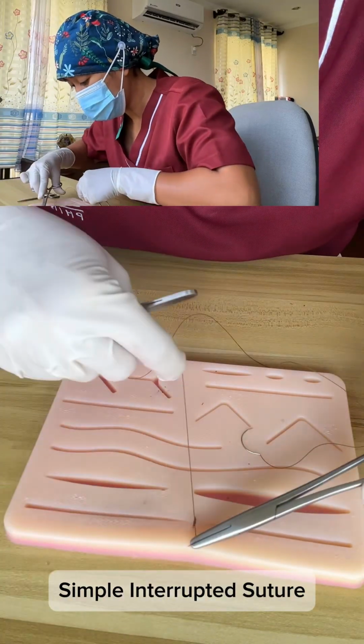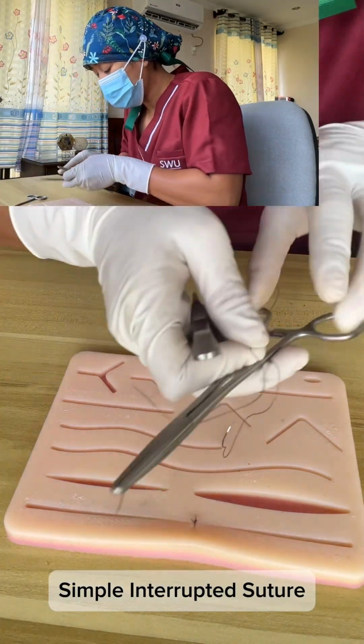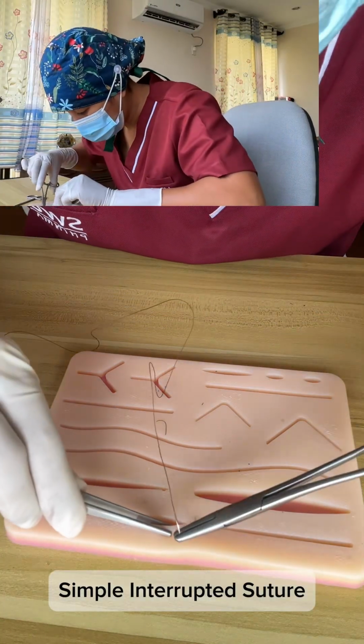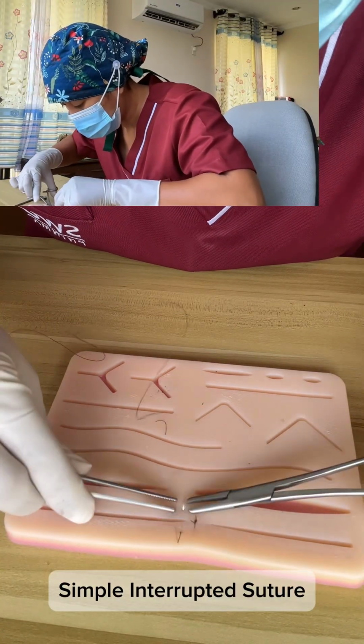It is most frequently used in skin closure, also in subcutaneous tissue to close deeper layers before skin, and more so for general wound closure. The simple interrupted suture is appropriate for many skin tissue because it provides precise apposition of wound edges, which is good for skin, fascia, and muscles.